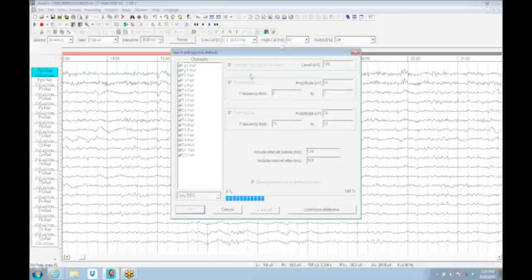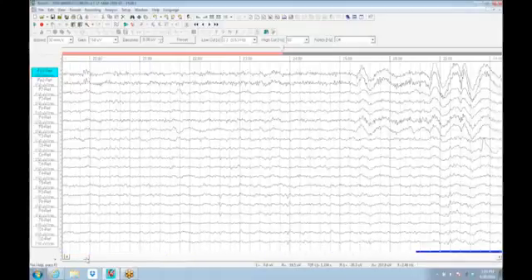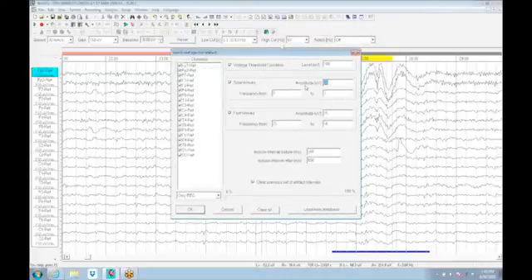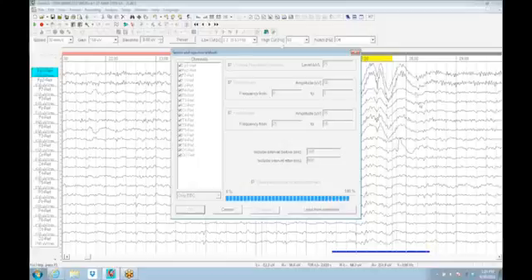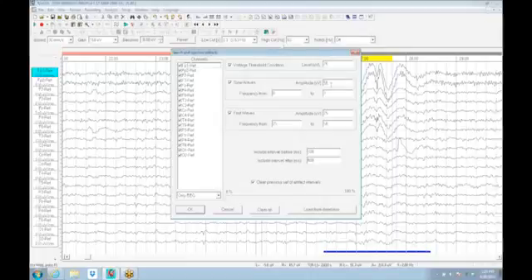So I can mark everything that fits those descriptions, and it'll underline those in blue, and you can adjust those to catch more subtle pieces of it. But essentially that can be tweaked to manually remove pieces. Again, alternatively, if we tweak this very gently to catch maybe 50 microvolts and maybe 75 microvolts, we'll probably catch more of this eye movement. We don't catch quite as much as I would like to catch. We'll have to adjust this down perhaps even further.